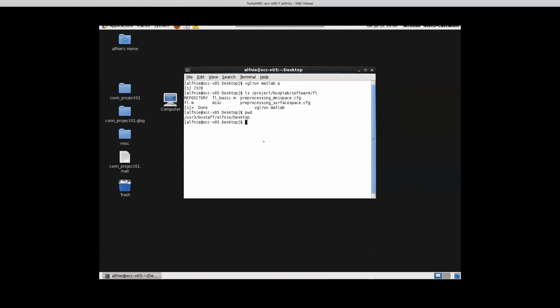So if you wanted to see how that projected specifically for an individual, if you were just looking at the individual and wanted to create an image showing how that activation occurred in an individual, and if you're not doing any further processing, like if you're looking at four different individuals, maybe comparing with ECoG stuff. Sure. Well, any time you run this, you're going to want to look and see, okay, what does the individual speech minus baseline contrast look like in that subject's own space? And I believe that's trivial to do.